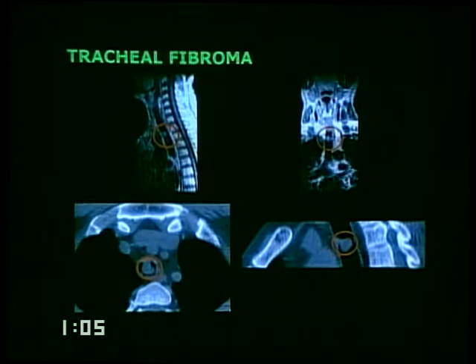Is there a chance this is going to be a malignancy? Yes, but it's a very small chance. If you see a tracheal fibroma, you know it's going to be biopsied. So you really don't have to characterize it further other than determining the level it's at. You want to assess the fat around the trachea. You want to see and analyze the area of local spread. Again, most of these are going to be benign and it's not a problem. They're going to end up having histologic confirmation anyway.